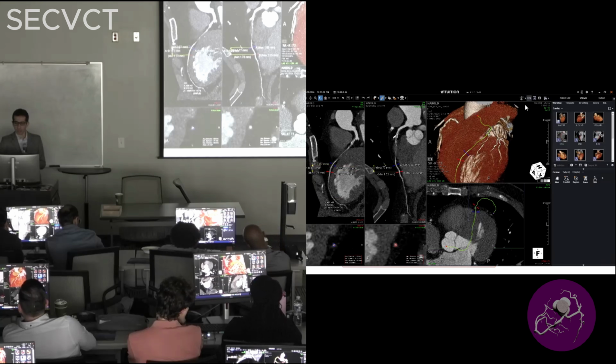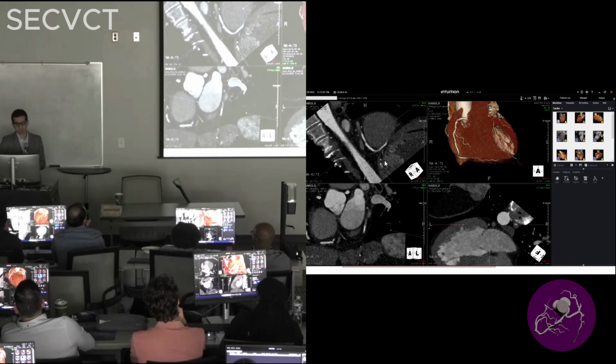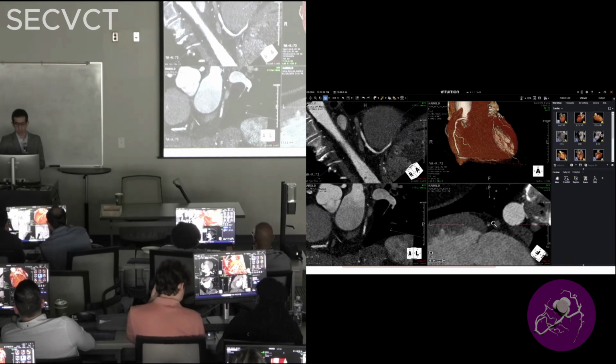Any questions about this? I'm going to just show the other segments, and we can look at a few slides together before. So I'm going to go here and show you the other segments. If you look carefully at the OM, one of the OMs was also hiding some severe stenosis with mostly non-calcified plaque. So if you look carefully at this OM, you will find some severe stenosis.